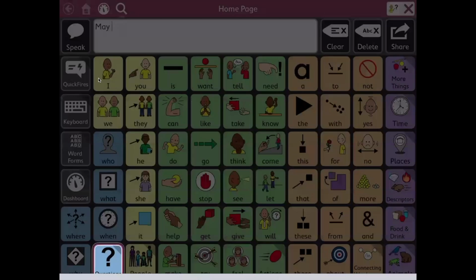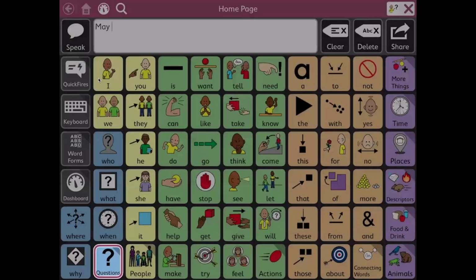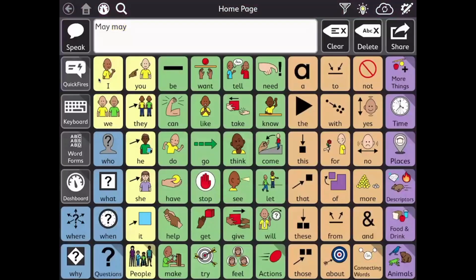May I? So, oh, question. There it is. So same May, like May is May, no matter how you use it, the way our mouth says it, but different meanings, and they're organized in different places within this platform. But otherwise, everything is in one spot and one spot only, and that's very helpful for our motor memory.